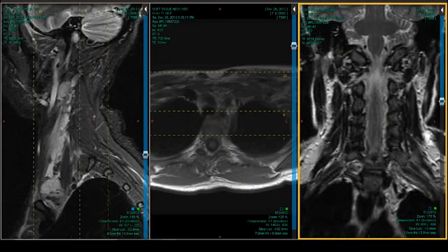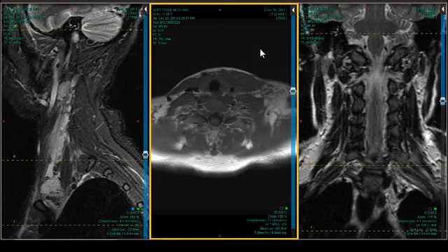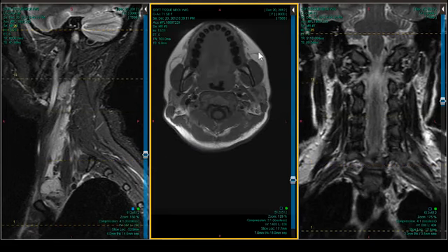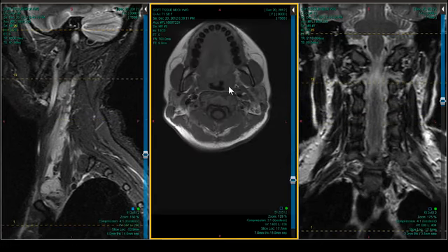And I'll give you a moment, because this is a terribly important case. And you said she's pregnant. Correct. So, pregnancy, neck swelling, that should do it for you right there. Yeah, you can get leg swelling from pregnancy from compression of veins, but neck swelling, what would be your clinical differential diagnosis for that?